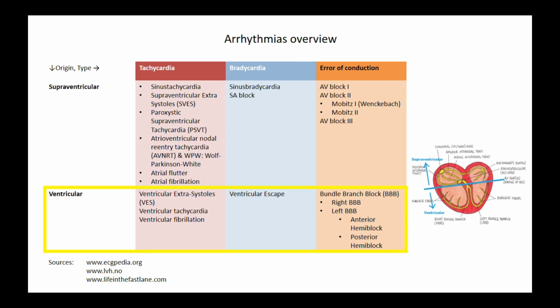Alright, so good job. Now we've covered all the supraventricular arrhythmias nice and effectively, and now we're going to be discussing the ventricular arrhythmias, which we remember are concerning the QRS complex and have a more direct effect on the blood circulation, the systemic and pulmonary circulation.